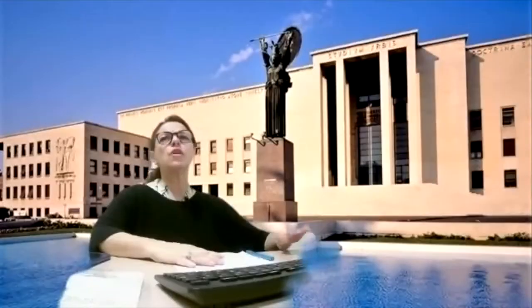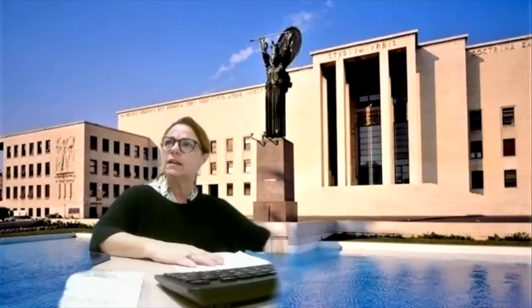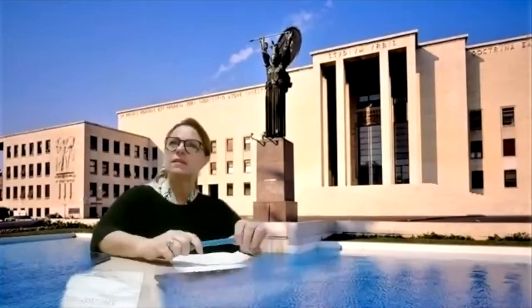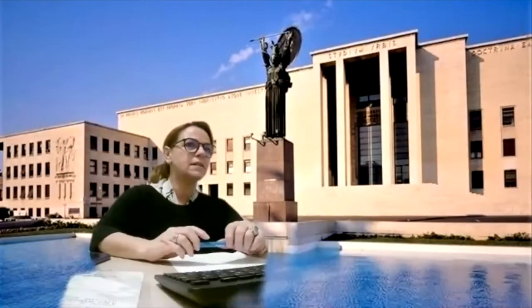Any comments from our radiologists, Valeria or Lisa, so far? Just scroll down again the high B value sequence, please. The axial? Axial. On axial plane, yes. Maybe just keep your images up for now, Richard.